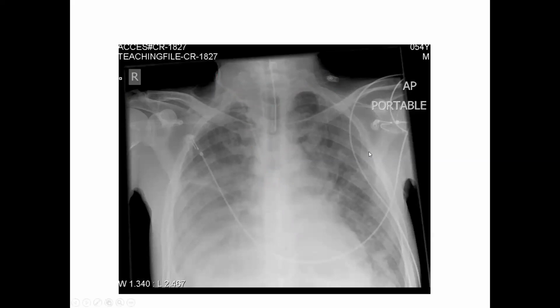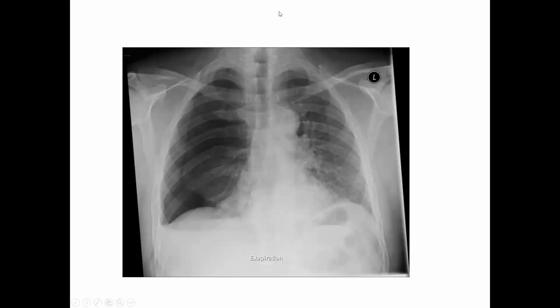set of chest x-rays. All right, so this is pretty cool here. If we look at this one, again looking at the tag, we've got our left side, so it's oriented. The clavicles are pretty well oriented. We see our gastric bubble down here. We've got a decent costophrenic angle over here. You can see the lung vascular markings, and you can see this little twist right here. That is your aortic arch, or in some textbooks it's referred to as your aortic knob.